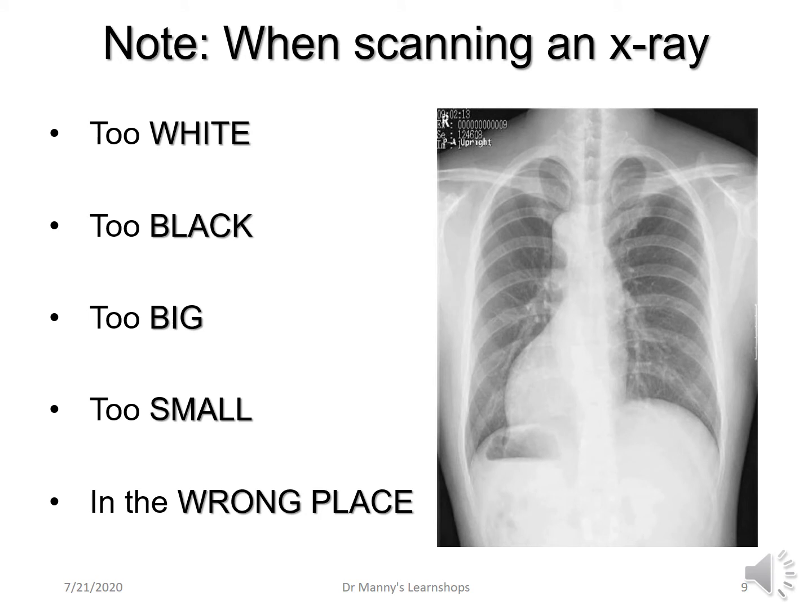Then you think of, gee, this intrathoracic structure, whatever it is, is in the wrong place. This is an example of dextrocardia with situs inversus. Basically the heart is in the wrong place. You don't know why it's there or what it is, but you know that the heart normally sits on the left side. This one is sitting on the right side, so it must be in the wrong place.